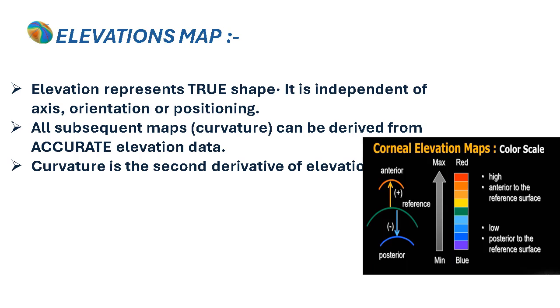However, in the axial maps, this is a very detrimental variable, that the patient should properly fix on the topographer, and variations of angle Kappa due to poor fixation will give a large range of variations in the shape of the curvature of the cornea, and sometimes lead to misdiagnosis of keratoconus. And this gives the advantage to the machines that are equipped with the auto capture options.